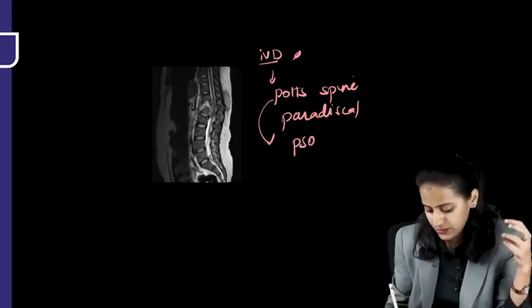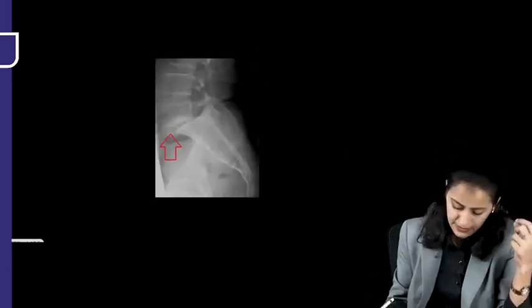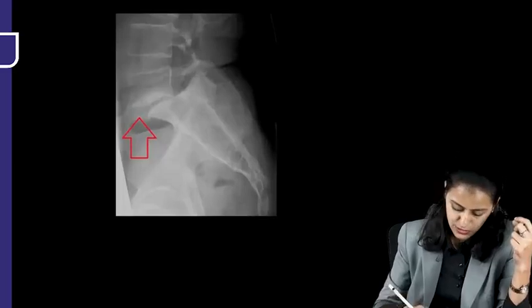The abscess can go into the psoas. It can lead to psoas abscess as well. Next one, what is this image showing? So, what do we see here?